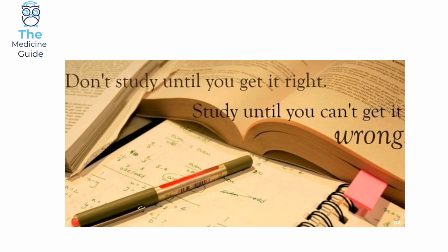If you've made some mistakes and you didn't get some of the questions right, then please don't worry about it. Hopefully you'll be able to recognise the error of your ways and also be able to hit the exam paper running, because you've seen some of the classic high yield images that crop up in exams.